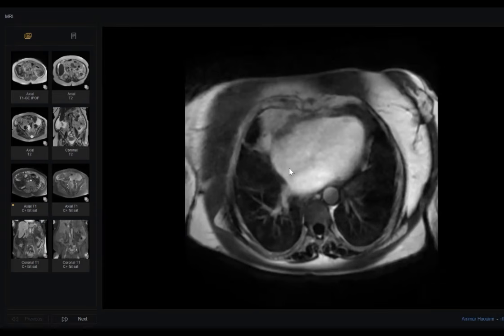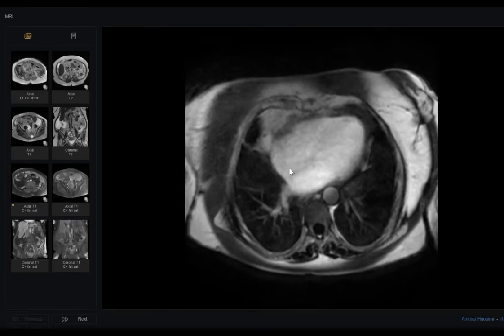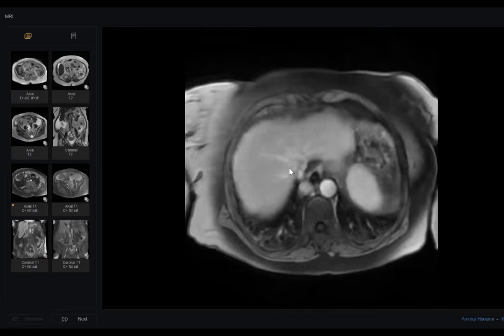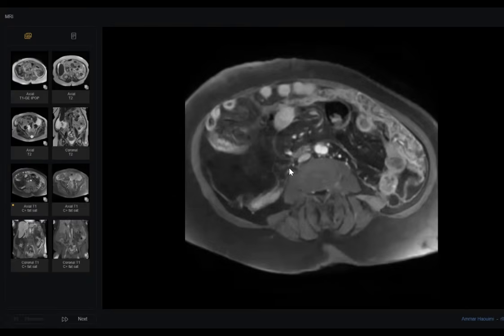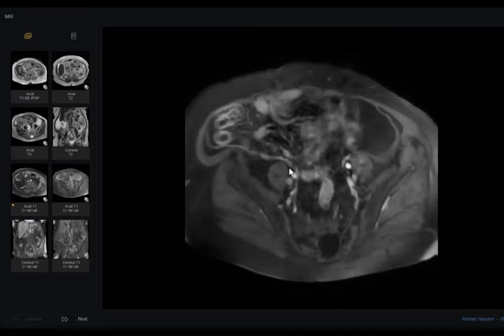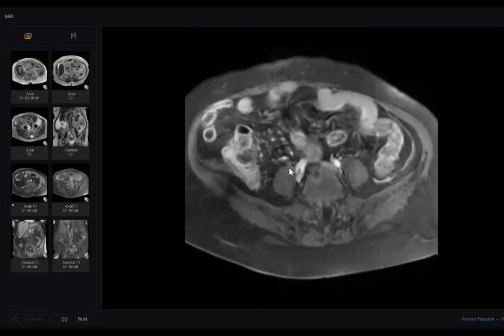Sir, there is omental caking, but in the lung windows, there might be some consolidation in the right middle lobe, in the right basal lung parenchyma. So that might be the infectious etiology. What's your diagnosis? Tuberculous peritonitis, wet variety, with both pulmonary and peritoneal involvement.